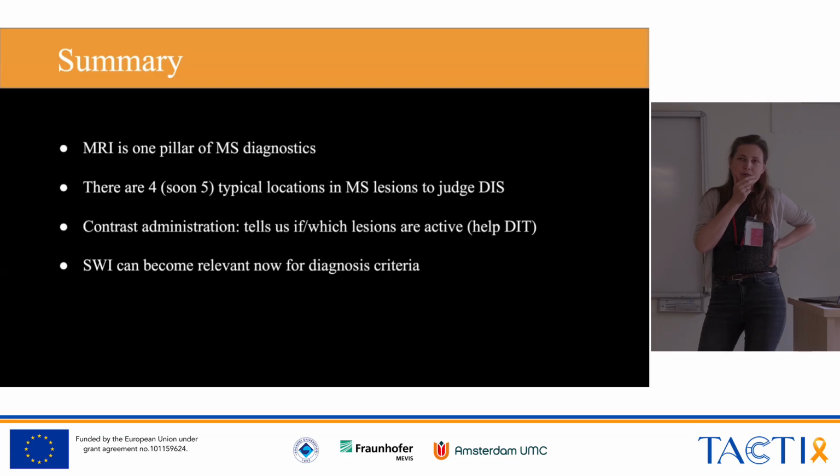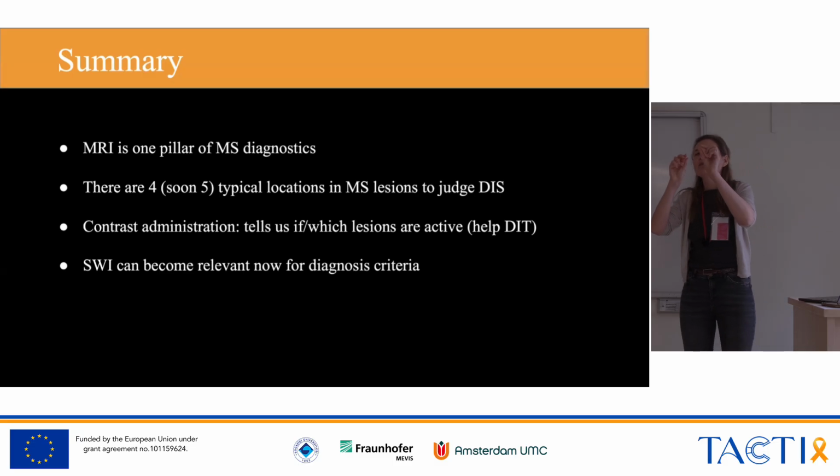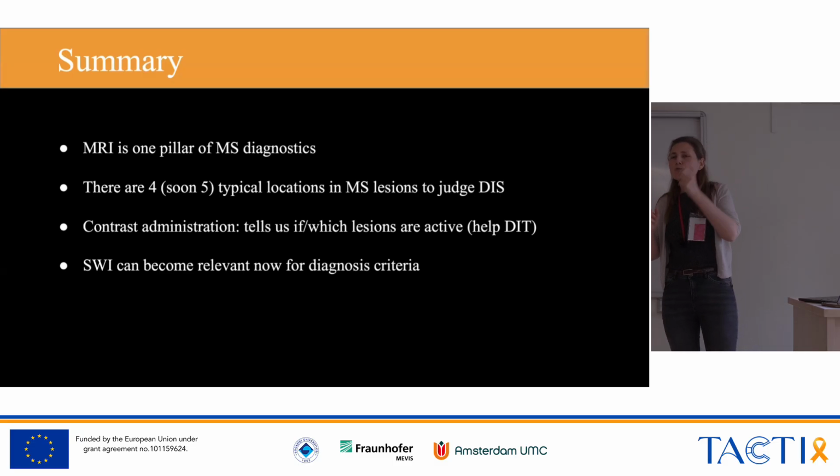So I must say, just from the amount of MRI scans, you'll be surprised how different two MRI scans of MS patients can be. Both have MS, and you would not guess that they both have MS. You have patients with a lot of nodular punctate lesions, and you read in your manual you have to look for ovoid lesions with a central vein sign, and then this patient only has punctate lesions more or less, so not the classic shape.